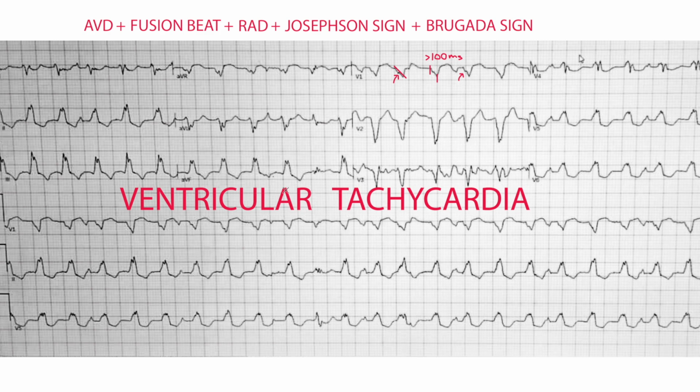One thing to mention, ventricular tachycardia, this one looks pretty nice, right? The problem with ventricular tachycardia is it can often spiral into ventricular fibrillation, and ventricular fibrillation is a step away from cardiac arrest. So that can be a pretty deadly scenario. Now, some ventricular tachycardias are more aggressive, more alarming, more deadly than others. Some are benign, if I can use that word. But anytime you get ventricular tachycardia, a red flag has to go up. And please be careful, measure everything out, and make the right conclusions.